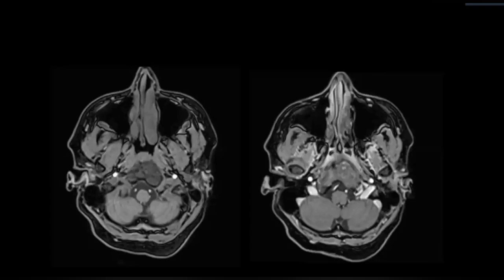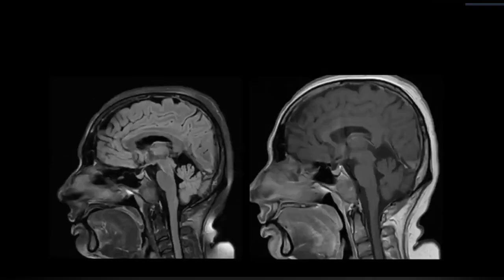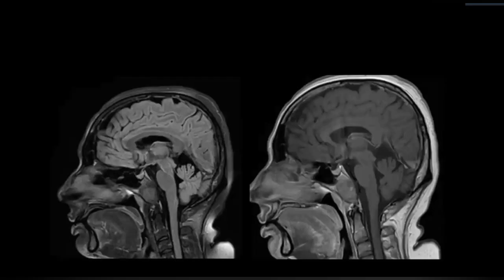So okay, fine, sir. If we go here, this is our nasopharynx. It is pterygoids. All these appear normal to me. This is the mucosa of the nasopharynx, which is normal. So this lesion is in the clivus. So, sir, in clivus, I would like to see its bone window on CT.